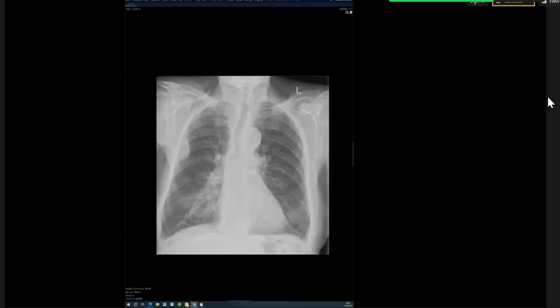Yeah, you would. But that's a discussion for the Viva. Common things commonly, is myeloma more common? Fibrous dysplasia, you tend to get asked more for pelvic bones, or it's a more heterogeneous appearance. But obviously, anything can look like anything. On this last case, why could this not?